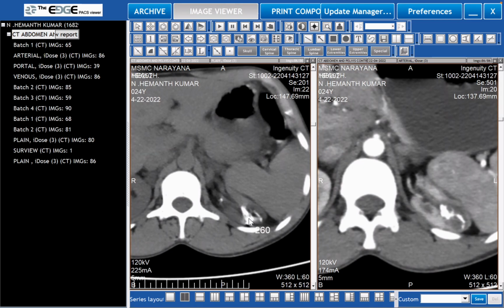No, we discussed that this could be an AV malformation where there is quick appearance of the venous phase. And if you can see the renal vein in the arterial phase, that is another evidence that you have a possible AV malformation. Yes, sir. But for today's discussion, let us say that there is no increase. Okay.